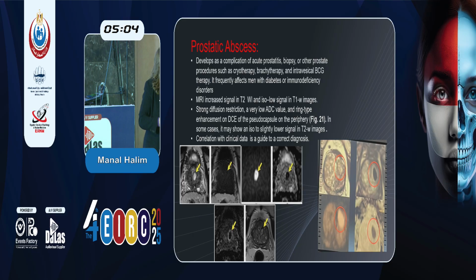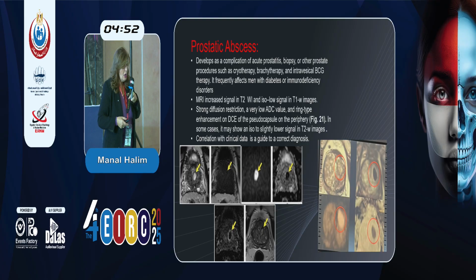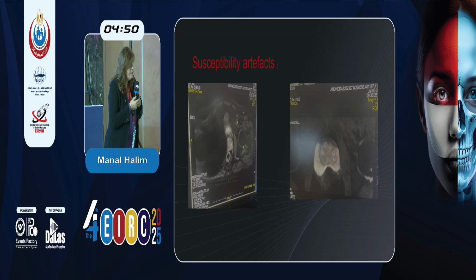However, because the restricted diffusion in this area is too good to be true, you have to keep in mind that prostate abscess may be the problem and not the cancer. Give contrast enhancement, and it will show you the marginal enhancement of the lesion.